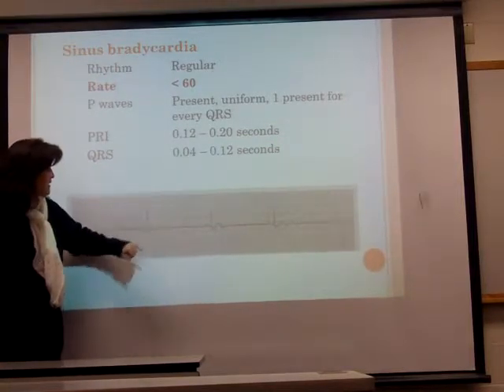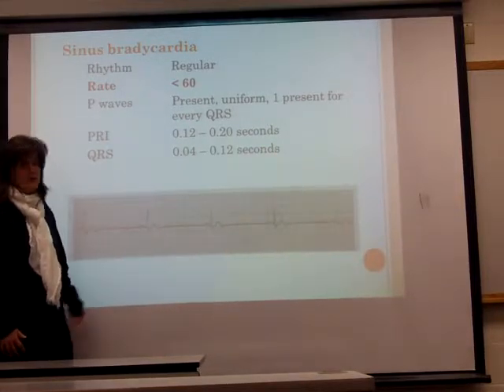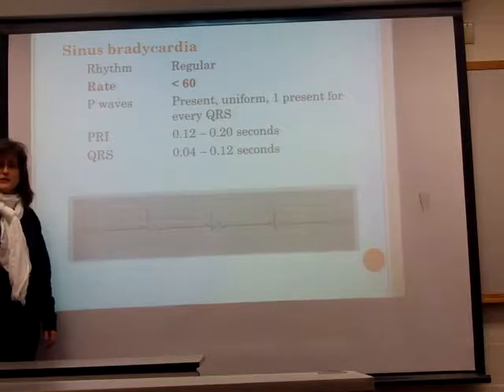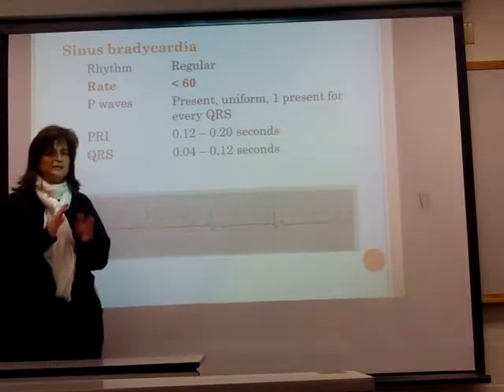I do have ST segment depression, so make sure you make note of that so you don't forget it. I'm looking at my T wave, certainly not peaked. It's after my QRS and it's upright, so very normal. So the diagnosis on this is sinus bradycardia with ST segment depression. Now here's where the treatment gets a little different.